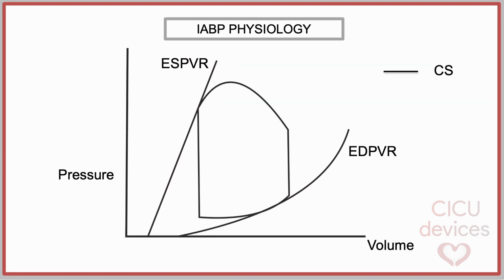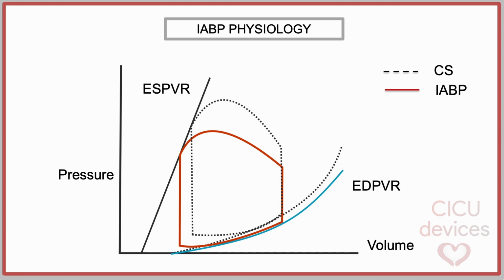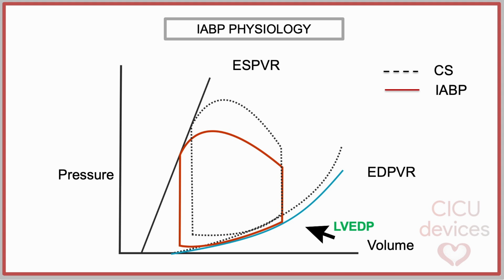The effects of the intra-aortic balloon pump can be clearly observed in the left ventricular pressure volume loops, as we will see next. With IABP deflation during systole, afterload is reduced, making it easier for the left ventricle to pump. This results in lower myocardial oxygen consumption and a larger stroke volume. Finally, the device exerts its effect during diastole as well, since the left ventricle remains less loaded and end diastolic pressure is lowered, factors that enhance coronary perfusion.